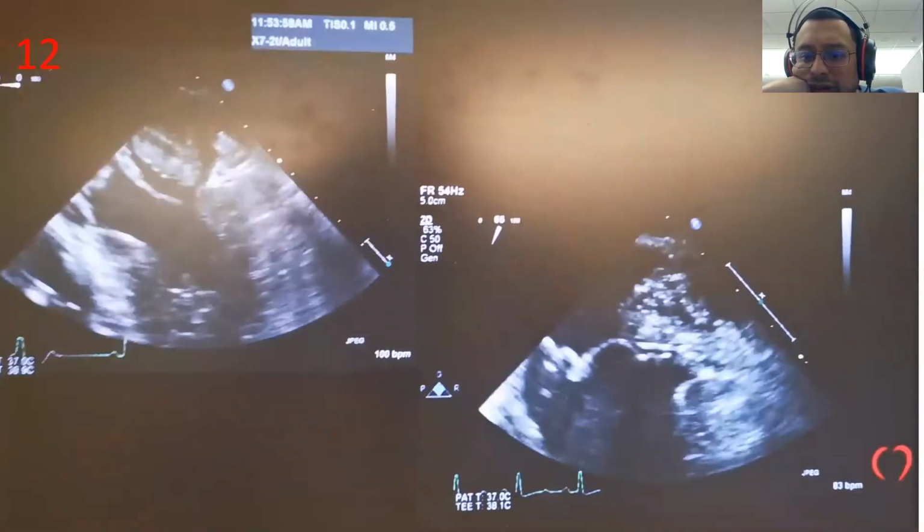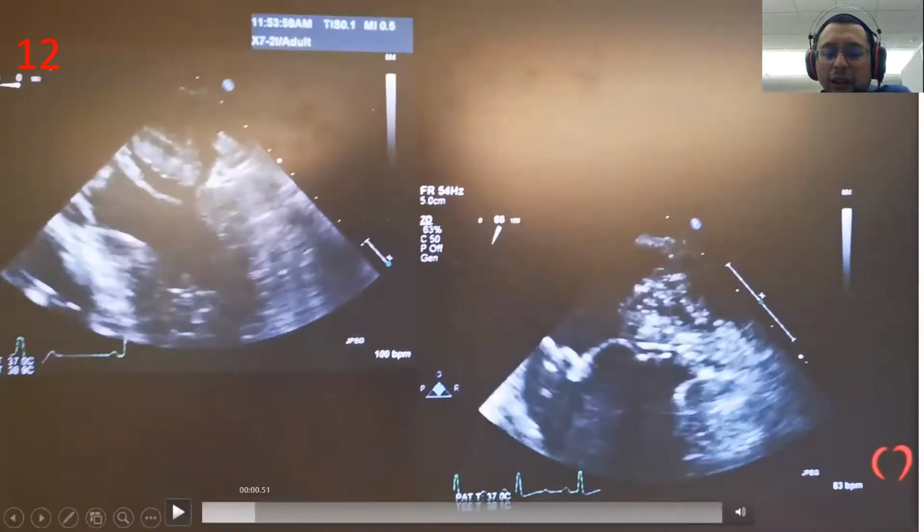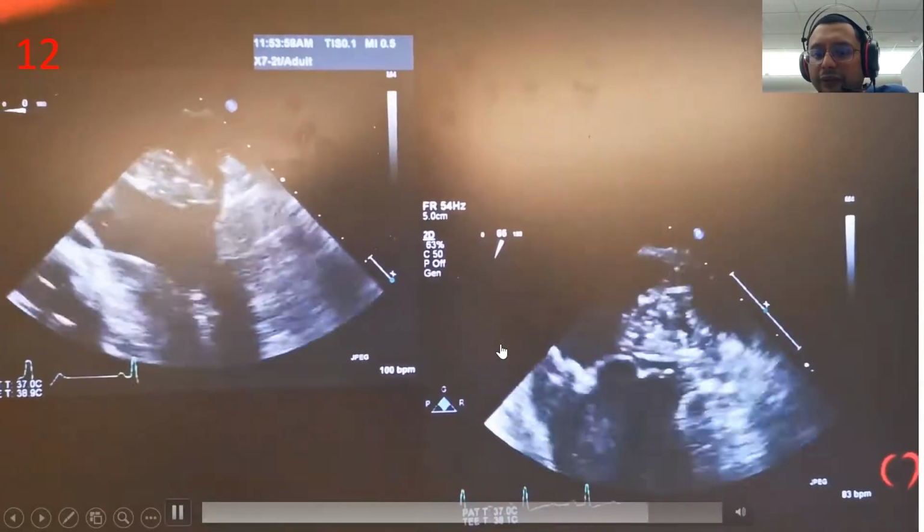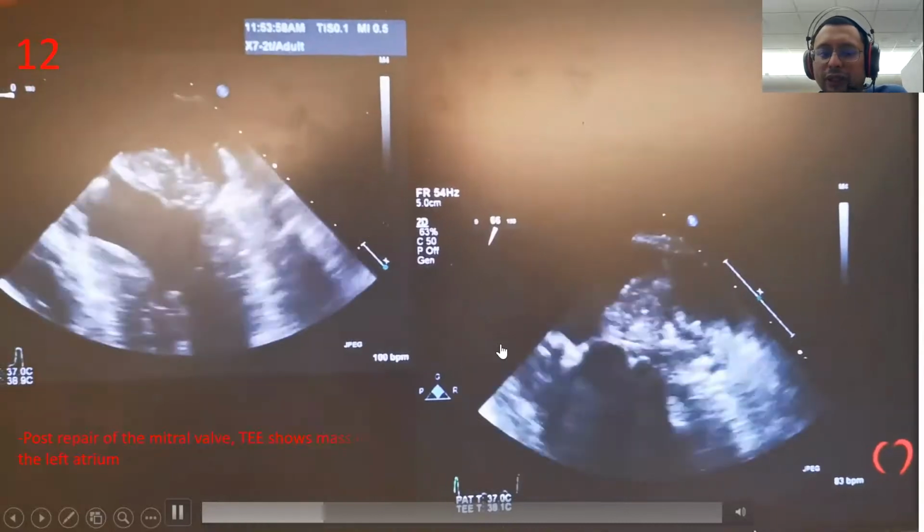I will just agree. Okay. So this is actually, I thought this was an abnormal mass, so this is actually amazing. You know what this is or not? Okay, let's say I go and change you this one.